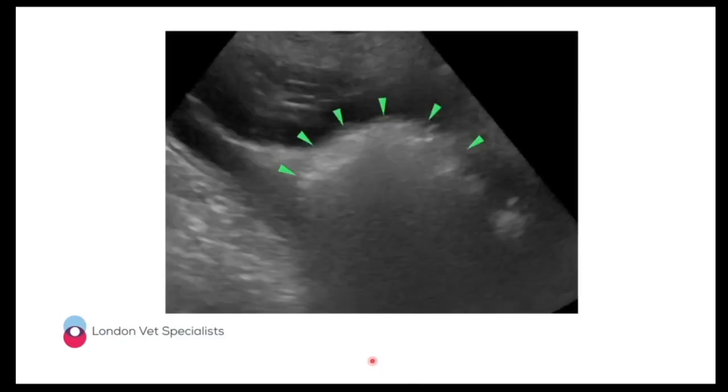And in this patient, we did an ultrasound, and that structure was actually present within the duodenum. This is the duodenum just here, so we can see the different layers of the duodenum. And this is the lumen, this is the mucosa, and we've got this quite large, quite clearly marginated, hyperechoic structure that's strongly shadowing within the duodenal lumen. So this is a duodenal foreign body, and the reason why we're not seeing marked dilatation of the small bowel is because it's so far up.